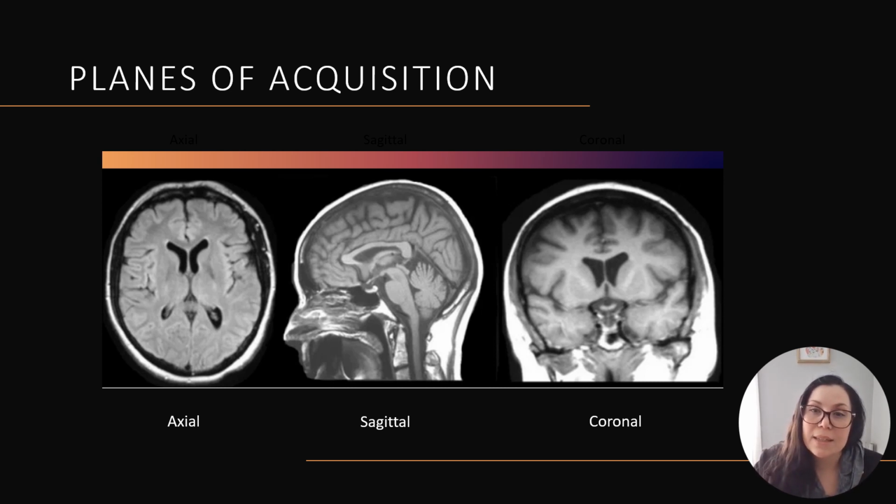Images are obtained like slices of bread, so the planes are in the direction you're getting images in. In CT, the images are obtained in a helical manner. The X-ray tube spins around the gantry. With MRI, the slices are obtained as in every other slice as a manner to reduce artifact. MRI artifacts are a whole separate in-depth subject.